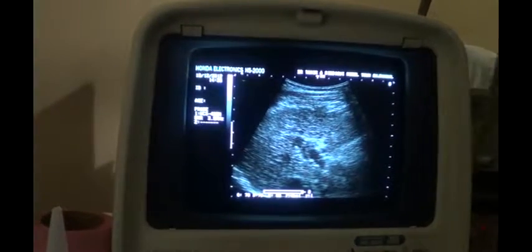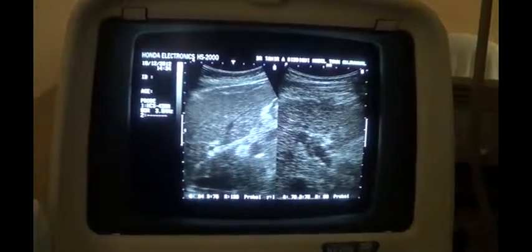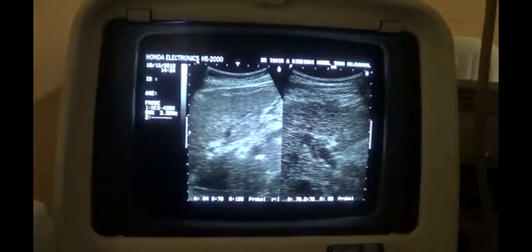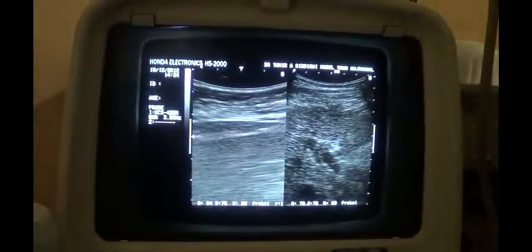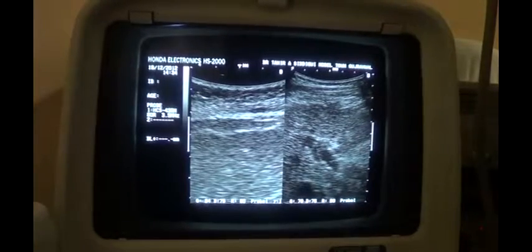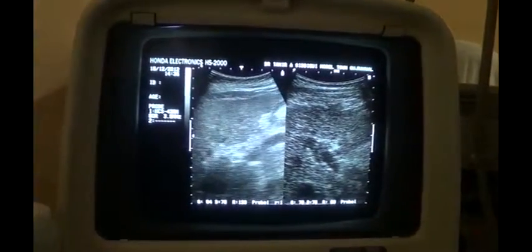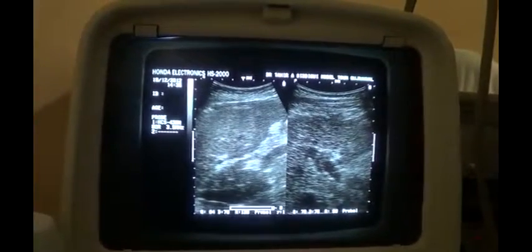On the right side of your image is another cirrhotic liver, but this is not an advanced stage. You can see the irregularity of the outer margin. This is the outer margin of the liver. See the coarseness and compare between the two segments in front of you.